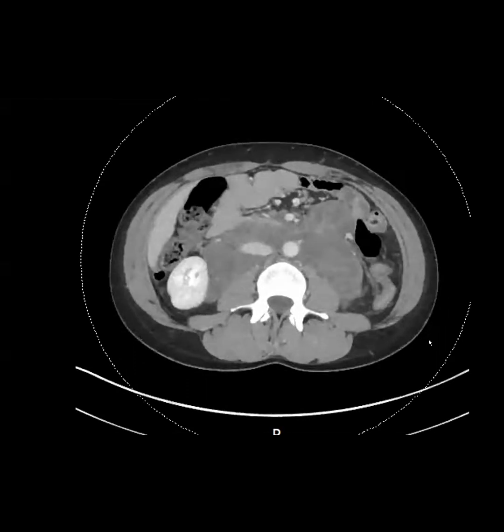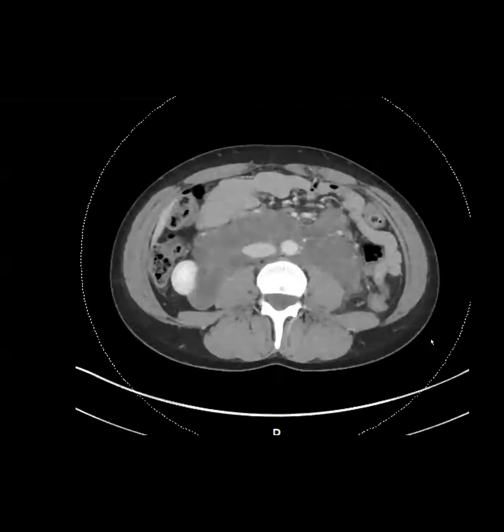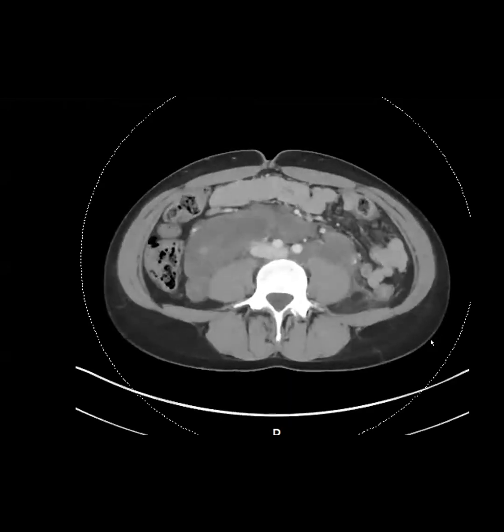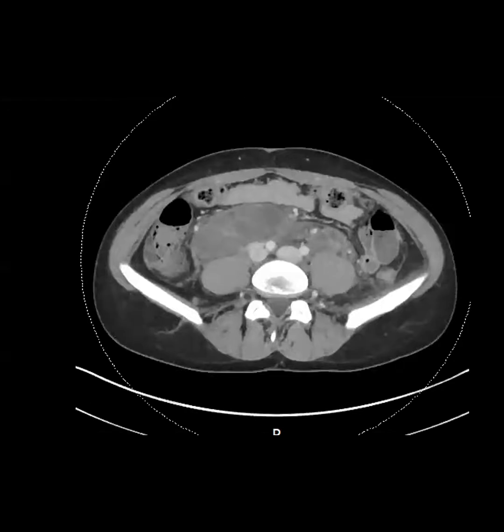It's hypoattenuating. It's pretty diffuse. It's displacing the vessels, but they seem to be going through it. I was thinking lymphoma, but lymphoma is usually denser. This is very hypodense. It's flashing a lot, so can you just keep it on a couple of images? I have the same thought. It was raising the vessels, but looks too hypodense. So the question is, is it one mass or lymph node conglomerates? I feel like it's probably going to need a biopsy.